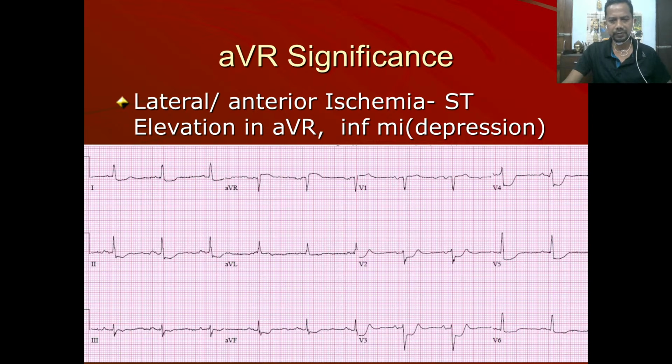I will show you an ECG which we diagnosed out here. The patient is still here, we thrombolyzed the patient, and it's a very important, very interesting ECG.